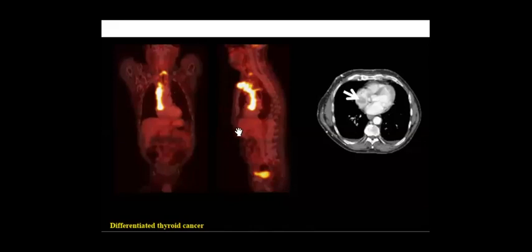But if it is de-differentiated and aggressive, then it will show, yes, anaplastic type. Yes, you get it, Nermeen. So when you find the anaplastic type, which is de-differentiated and advanced, you can see how this aggressive tumor can even invade the superior vena cava as well. Yes. Okay.